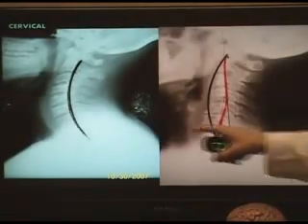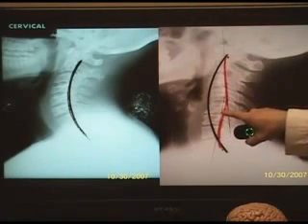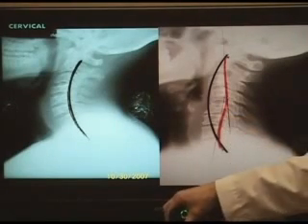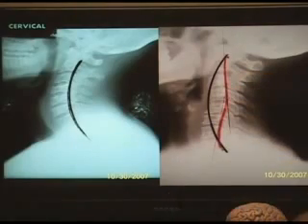This is phase two. That's normal. In phase two, you can see now the discs are getting real thin in here. This was a patient who had chronic neck pain. She had pain down into her arms and pain into her shoulders because the discs were getting degenerative. They were getting small, and so they were putting a tremendous amount of pressure.